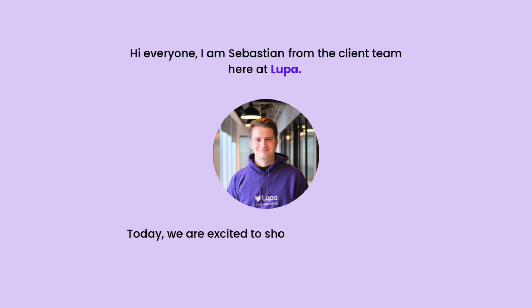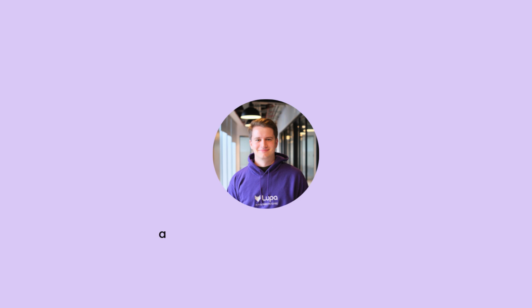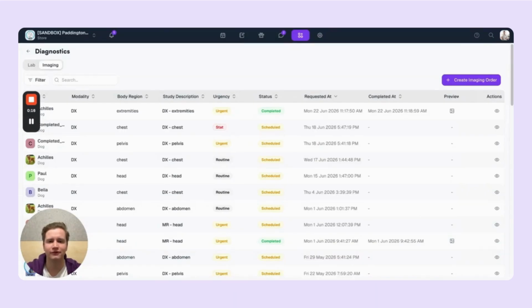Today we are excited to show you how imaging in Lupa works and how it matters in your day-to-day. The value of imaging in Lupa really comes down to three things. First, it saves you time. You send a request, run the scan, and the image comes straight back into Lupa automatically, with no exporting between systems and no chasing files.